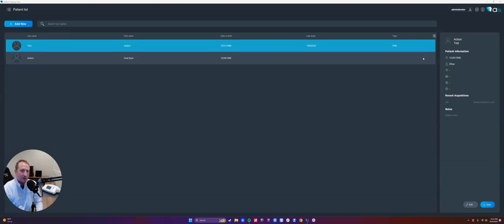Okay, so here we are in the AIS imaging suite. Depending on which practice management software you have, you may have come to this page through a different bridge or link directly through your PMS, or you may come in here directly if this is your standalone imaging suite. But a couple things to note here on the screen.